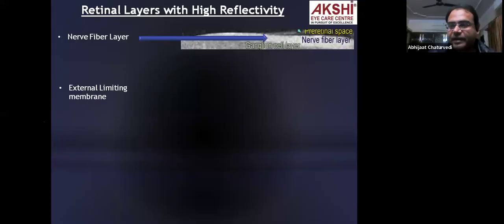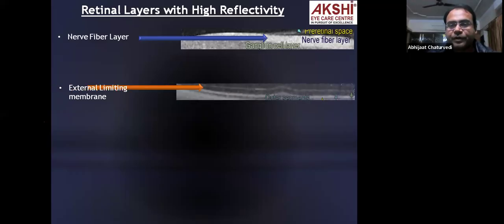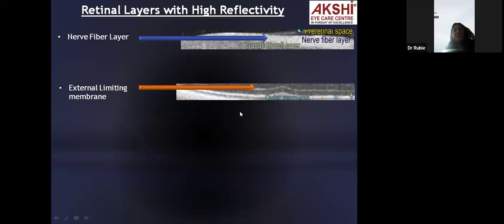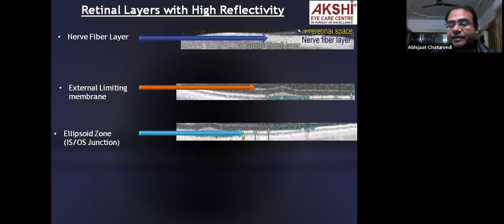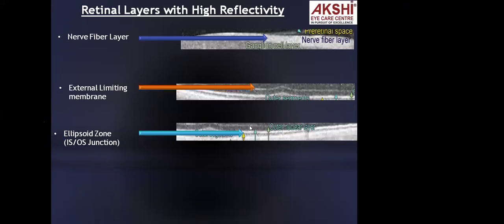Now remember that anatomy of the three lines which I told you before, and start correlating those lines. The first line is the external limiting membrane. Okay. Now, according to that anatomy, after the external limiting membrane should come the inner segment of the outer complex of the photoreceptor, which is this hyporeflective space. After this would come the ISOS junction. So this is the ELM.